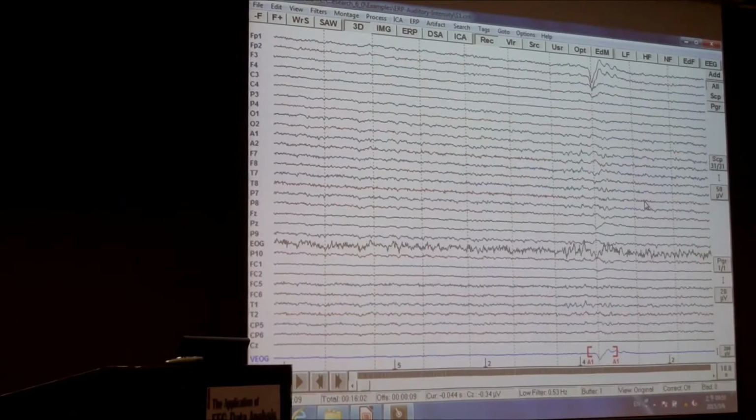Some questions about artifact correction. So this is just eye blinks. This is a very simple artifact. ECG is another artifact, but you certainly can go and make some more interesting, I would say. We can define our own artifact topography with the pattern search. This is a very unique feature of BESA, and I would say that this is one of the strong.